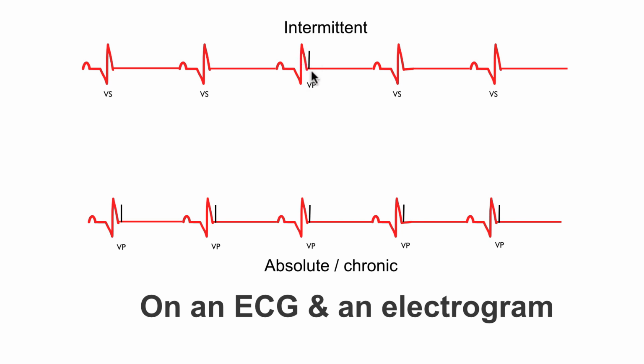You can see here it delivers its output pulse, which is signified by this pacemaker spike, but actually it fails to depolarize the tissue. The reason is that the tissue has only just depolarized and is now repolarizing and is refractory. What this means is, no matter how much electrical energy you deliver to tissue when it is only just depolarized, it will not be able to depolarize again.